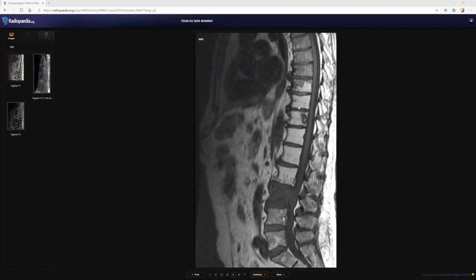Can you point out which one is abnormal and which one is normal? This, and this upper thoracic, are abnormal. Basically this is abnormal, but I think there are some changes in these vertebrae. Maybe they are not infiltrative, maybe because of some metabolic reason. But this L3 is metastatic with a soft tissue component involving the spine, impinging on the cord at this level. What about these vertebrae? Maybe this is age related. Ideally, the marrow of the vertebral body should be completely fatty. So there is some replacement of the fatty marrow here, but it doesn't look metastatic as in the L3 vertebra.